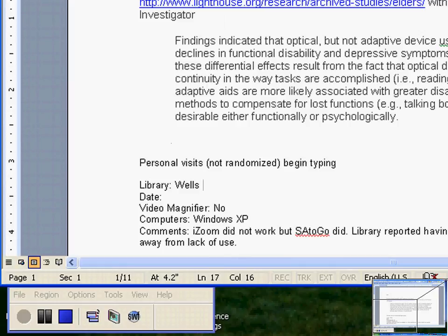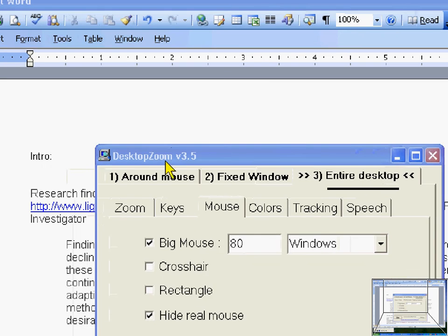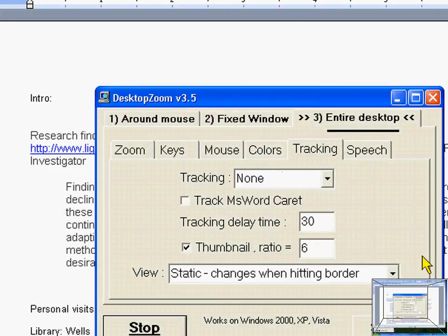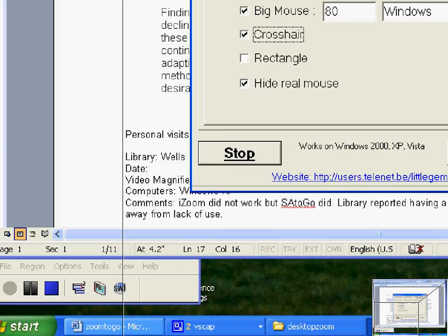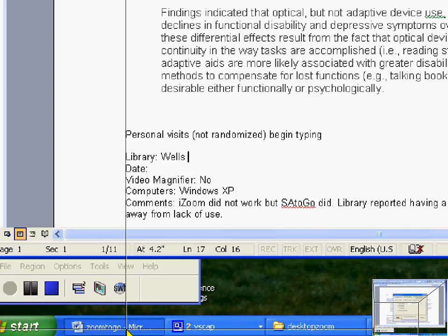I'm going to go back to the Word document, and we'll open the Word document. Even though the mouse has not reappeared, with the crosshair I now have the ability to, for example, move behind the word typing, click, and move the caret there. Or I can go down to the word XP, click behind it. So I've been typing. This makes it a little bit more useful. Again, not sure why that happens, but it's a free program, so if this is the workaround, that's pretty good.